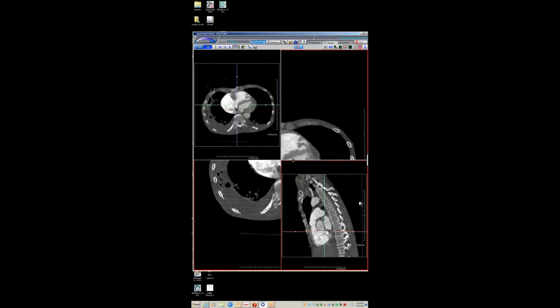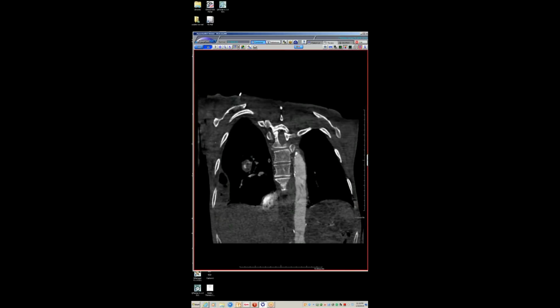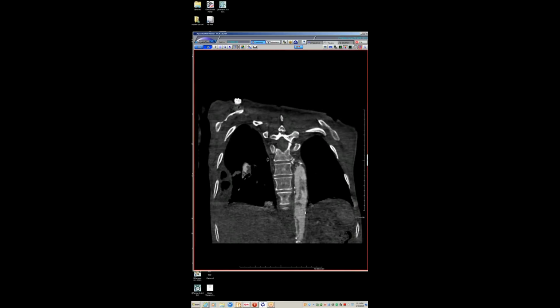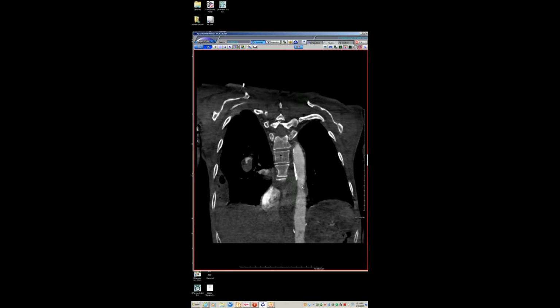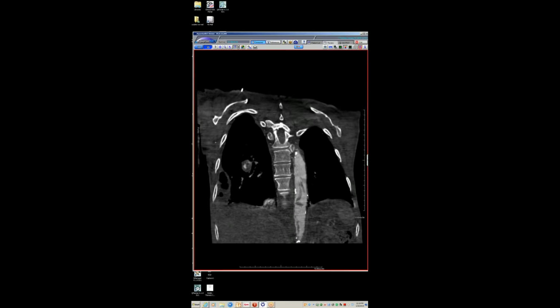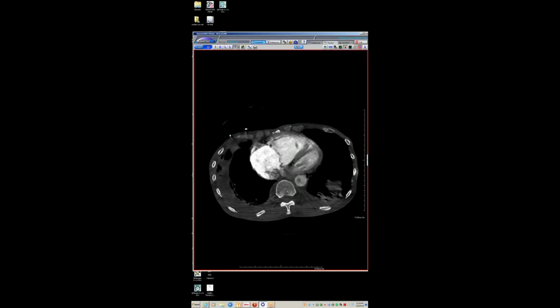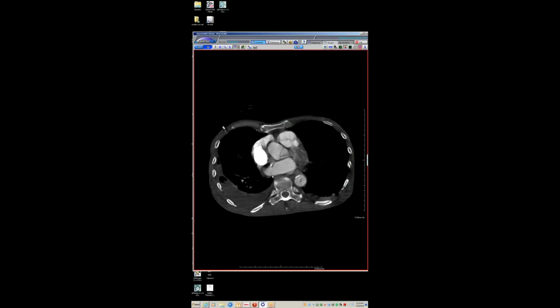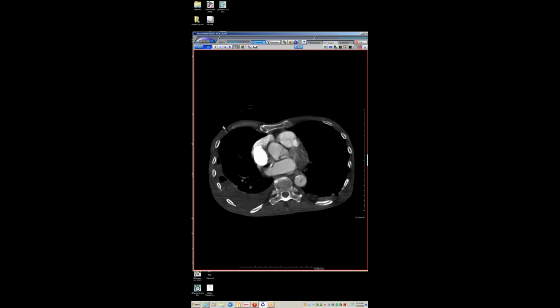And the bad thing about this was that they saw something dangling in the aorta, but they called it mixing artifact. Now, I know this is before, so we have this PM shift where people who aren't chest radiologists read chest studies, which I am very much against. Nonetheless, you can see this serpiginous worm-like filling defect in the aorta, and the only way that's going to happen is through your good old friend the PFO, which you can even visualize here because of the mass.